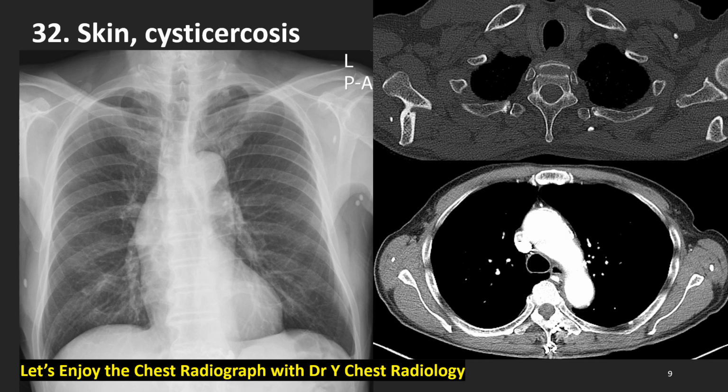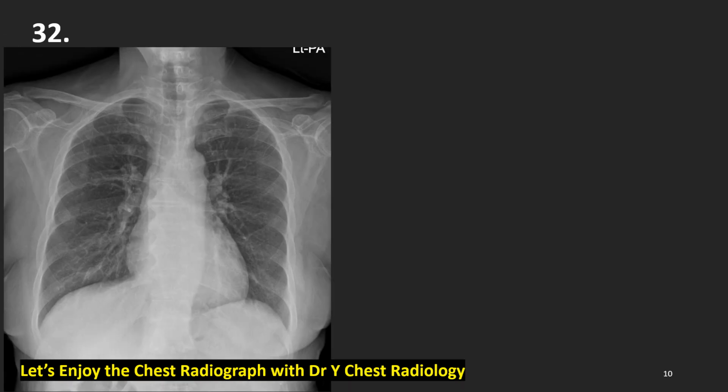The answer is skin, subcutis, muscle cysticercosis calcification. Are you correct? Probably this calcification looked like this one, pseudopulmonary nodule. And this contrast enhanced CT shows this one, this one, this one. Cysticercosis. Third case. Where is the pseudonodule or pseudonodules on this old woman's chest radiograph?